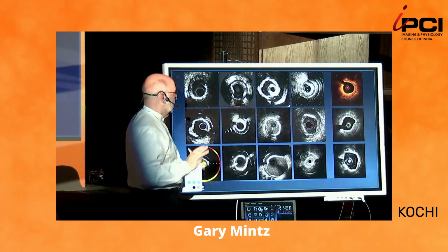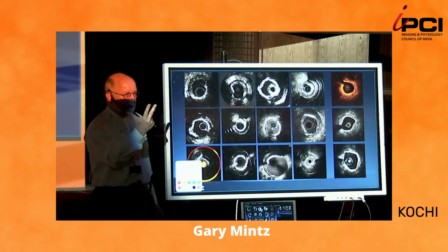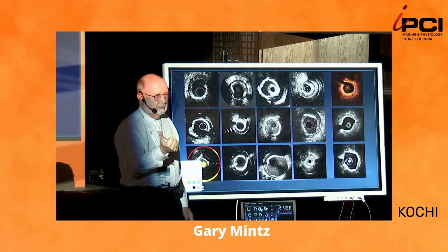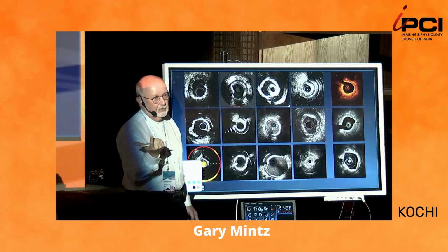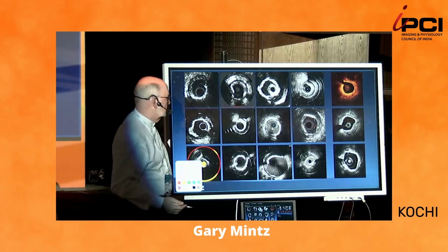Three things cause reverberations: calcium, metal, and plastic. Okay? Where do you have metal? Stent. What do you have? Plastic. Guiding catheter, and maybe a covered stent.